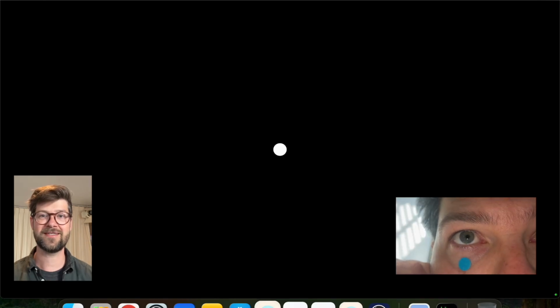Once you press the green continue button, the animation should start. You'll see here I'm watching the calibration animation. Recording on the phone starts automatically when the animation starts, and it won't start until it's confirmed that it's recording. It's down at the bottom right, you see a very small green dot. That's showing that the phone is actively recording right now.